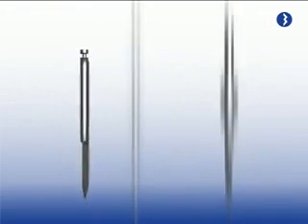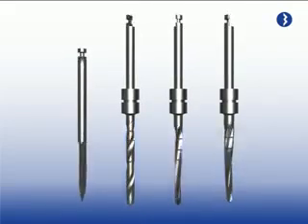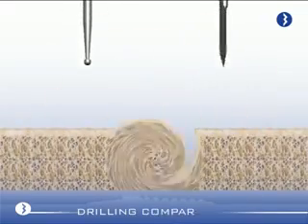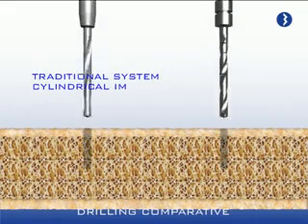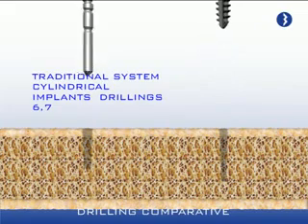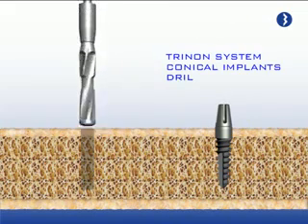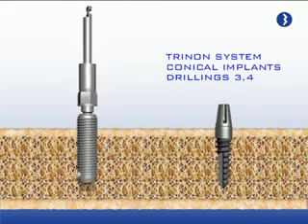The Q-implant coil design is different from traditional implant systems in that it helps achieve a reduced number of drillings continually. We can see a comparative scheme between the Trinon system and traditional systems. The great simplicity of the Q-implant drilling systems gives us 3 great advantages. Reduction in surgical time. Minimum osseous reabsorption. Post-operation is untraumatic for the patient.